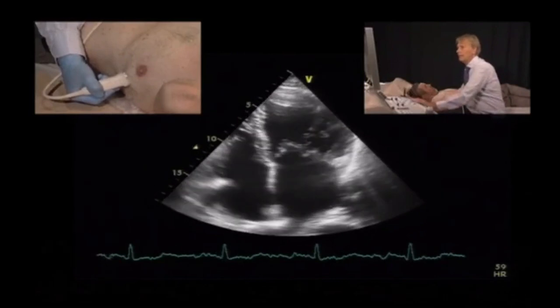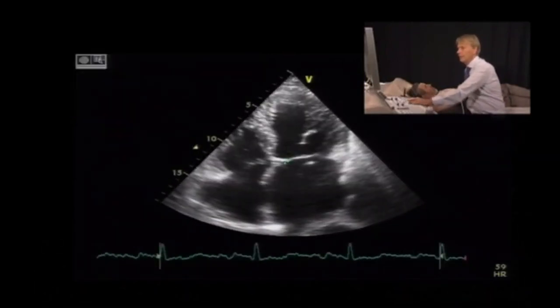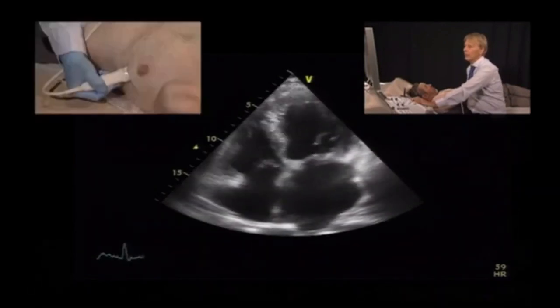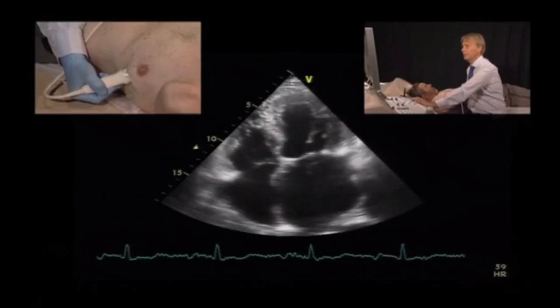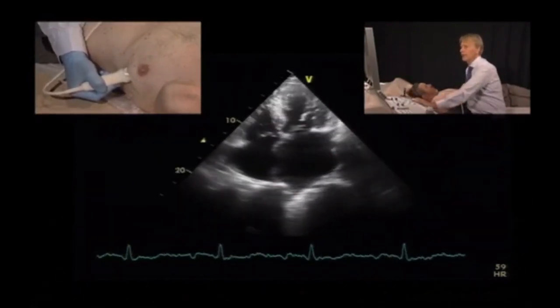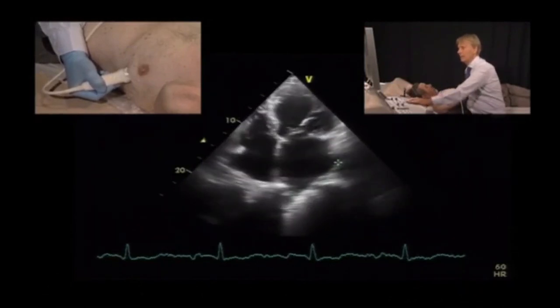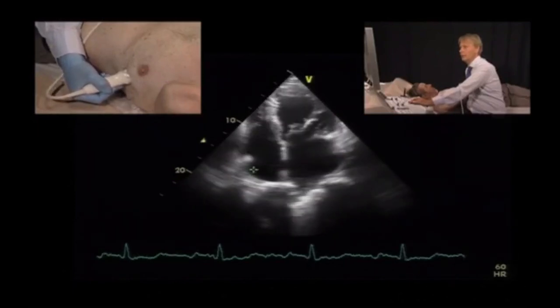The next thing we see is that the patient has a dilated left atrium. The length of the left atrium is somewhere in the range of 74, 75 millimeters, so probably also an increased risk for atrial fibrillation. Furthermore, we can appreciate that the pulmonary veins are dilated here and here, and also that the interatrial septum bulges towards the right.